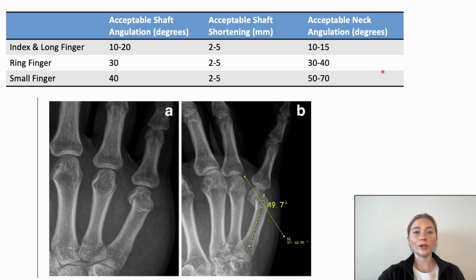This is a good example of when measuring angulation on the X-ray is important. The fracture angle is best measured on the lateral or oblique views. And so, as we already explored in the last video, we looked at the angulation table with this image, and we saw that it was less than 50 to 70 degrees, and so it will likely heal in an acceptable position for function and does not need further reduction.